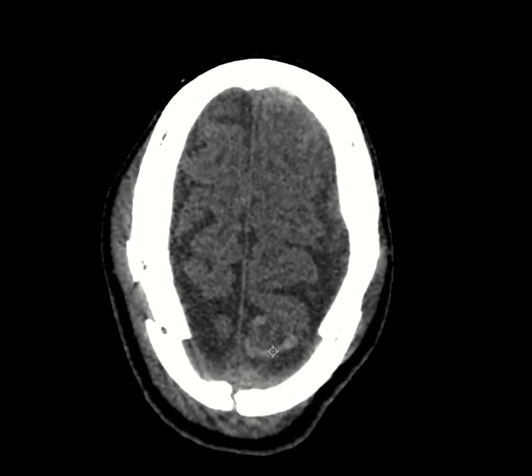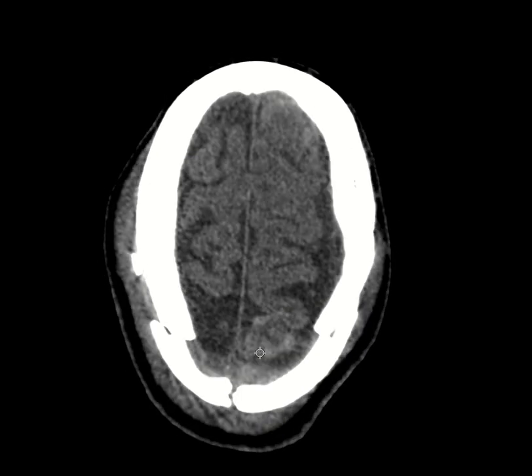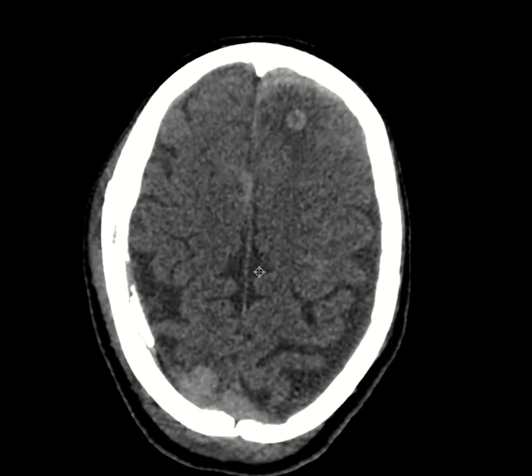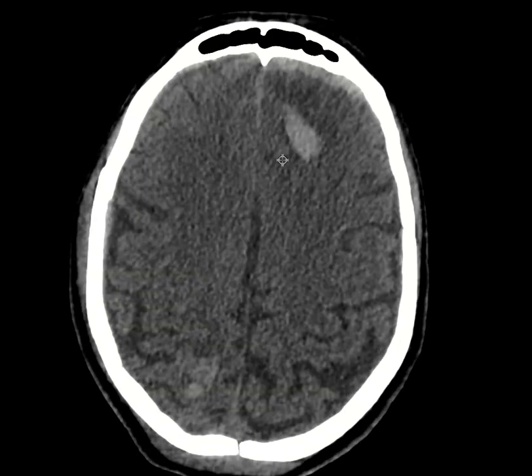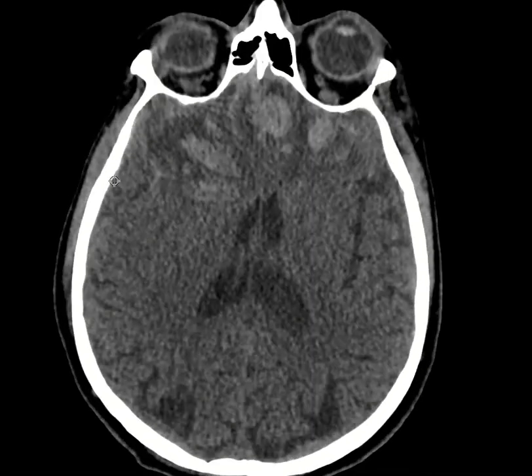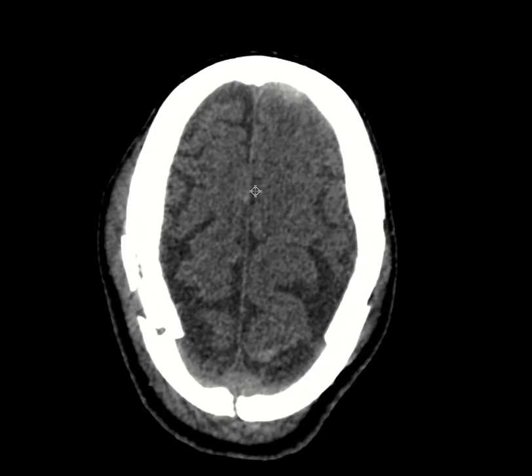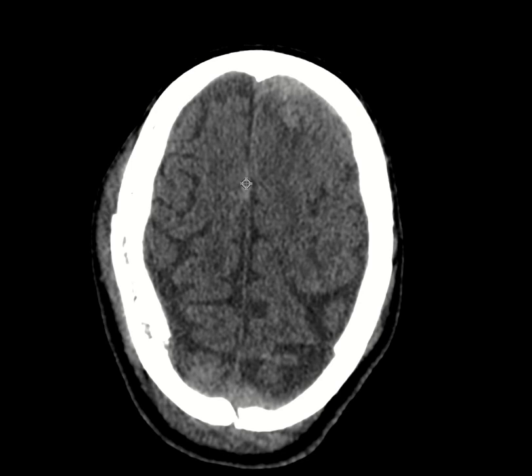So it's important, as I said, to say these are subarachnoid hemorrhage, because these are not getting that much bigger. If the patient has just isolated subarachnoid hemorrhage, they can just watch the patient. It's not going to grow that much. So we have different areas of subarachnoid hemorrhage, parenchymal contusions, and subdurals, as you see here. The other area that I would like you to look at very closely for subdural is along the falx. This patient had some areas of minor hemorrhage around the right parafalcine area.